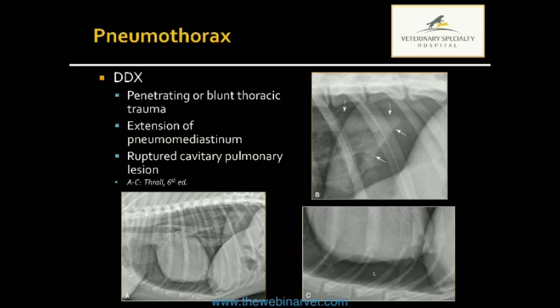It's not that the heart is really being elevated, it's that there's a mediastinal shift due to the pneumothorax, and that's what causes that apparent separation. But again, just pay very close attention to the vessels, and that'll give you a much better idea of where the lungs actually extend to.